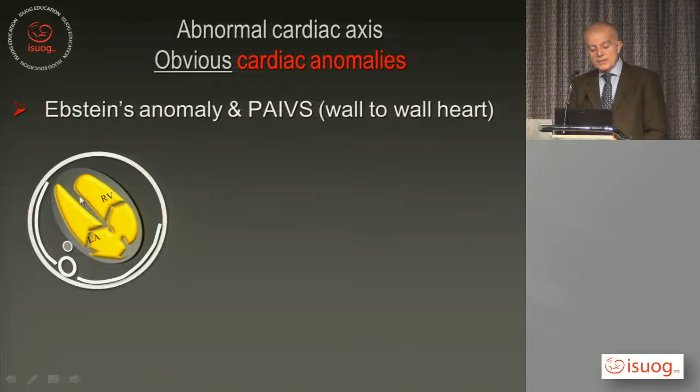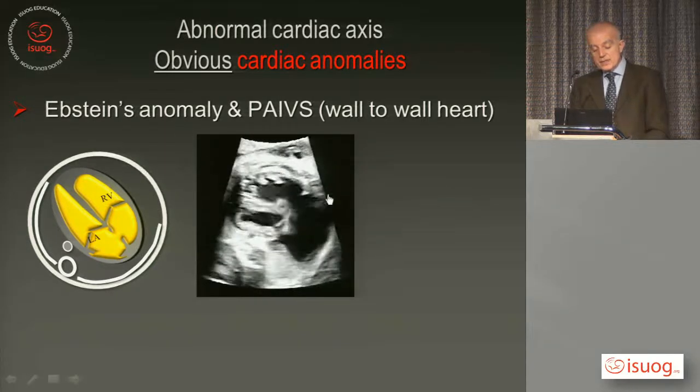So whatever the reason the heart is enlarged, in this case I have a pair of abnormalities. This is the classic setting of pulmonary atresia with intact ventricular septum and severe insufficiency of the tricuspid valve leading to severe atriomegaly and consequently cardiomegaly, and you see that the axis is roughly 90 degrees.